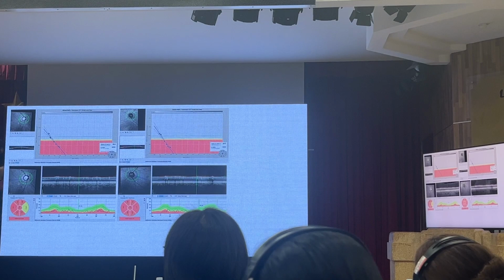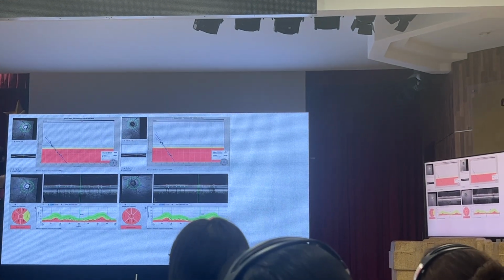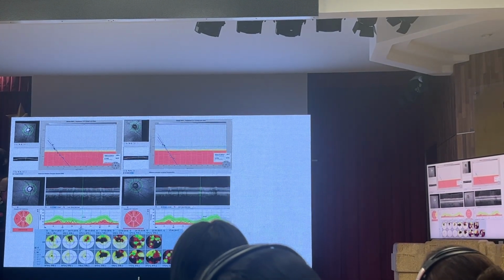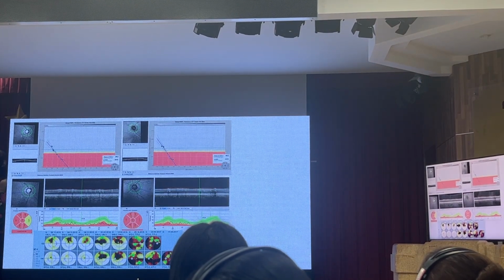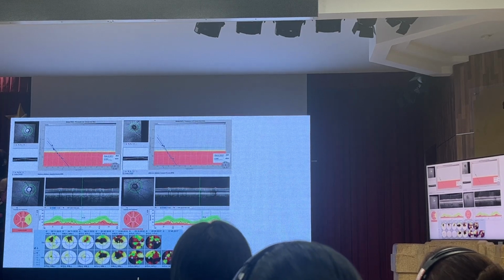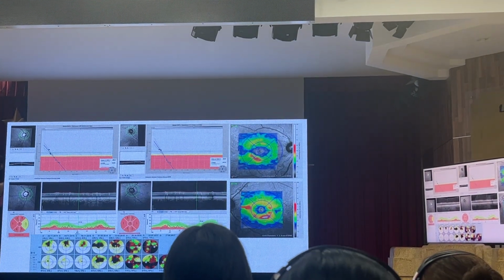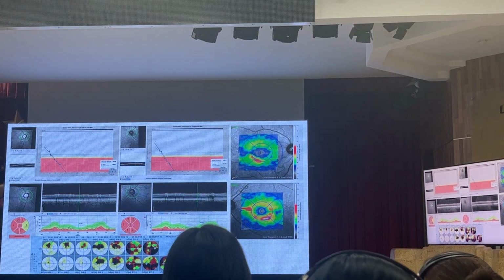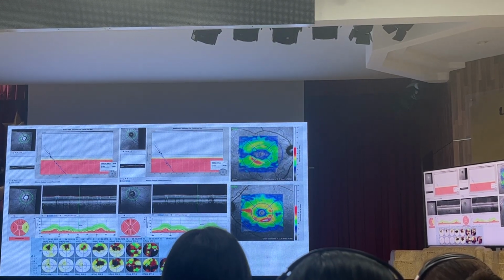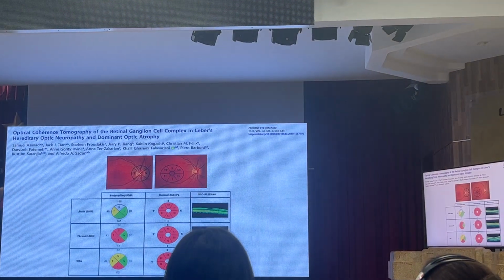It's important to make the right diagnosis, and therefore we're sending the patients for genetic diagnosis and look for mitochondrial mutations. This is the visual field of this poor patient, decreasing rapidly to an extent where he's no longer allowed to drive a car, no longer allowed to work. These are the ganglion cells. This is a posterior pole analysis showing red would be normal, that most of the areas are no more red, that the ganglion cells are lost substantially.